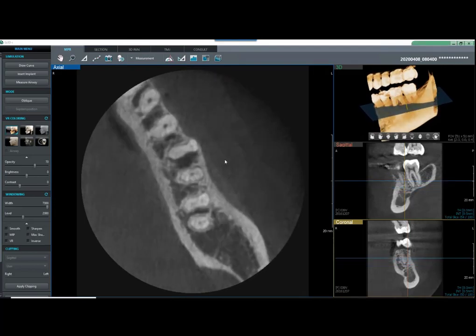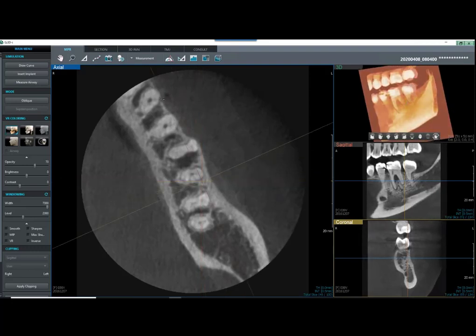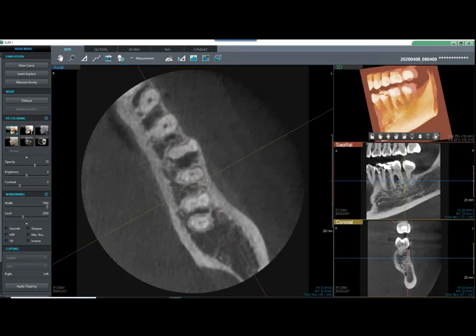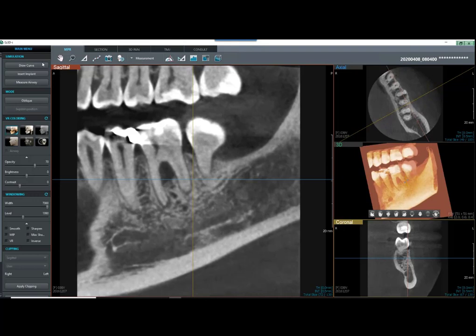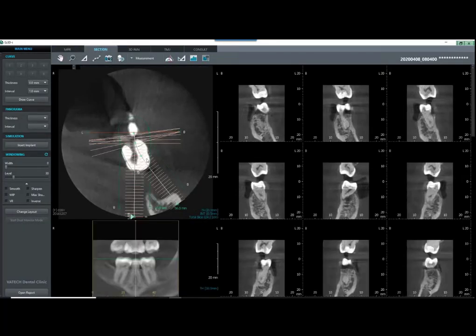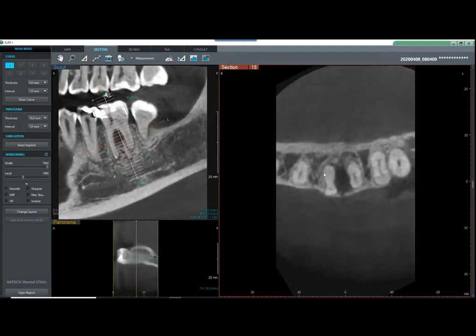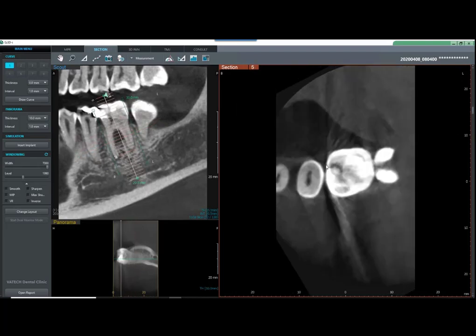So what would be some ways we talked about to look for a root fracture on this or identify different canals? What I'm going to do is rotate my sagittal slice across, enlarge my sagittal window, and let's start with drawing the curve through the long axis of the tooth. Occlusal surface through the furcation, down through the roots, double click. And I do have my one curve drawn over here. So let's double click and scroll up.